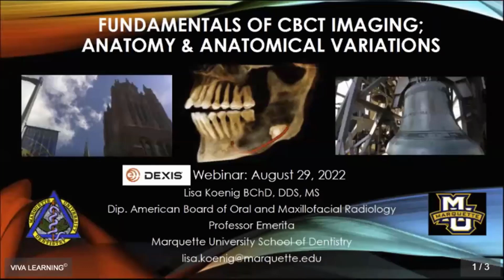Are there any radiographic signs you look for with lingual nerve injuries other than a break in the lingual cortex? With lingual nerve injuries, because it's soft tissue, remember, we are not going to be able to see that actual damage to the nerve. So what we have to do is correlate what we see radiographically with our clinical findings.